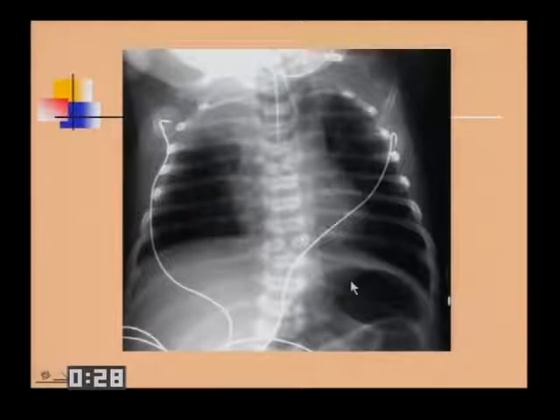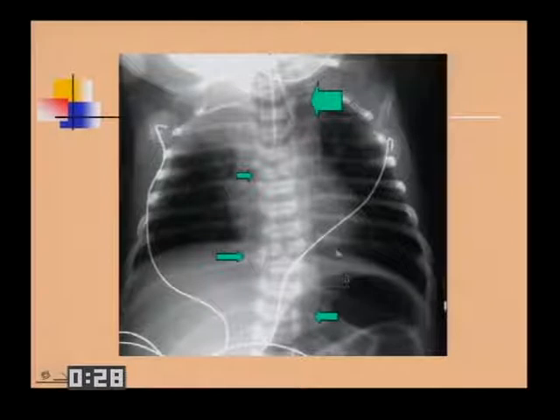But when you see all of these abnormalities in the vertebral bodies, cleft vertebral bodies, another cleft vertebral body, two examples of congenital bar deformities, which will increase scoliosis as the patient grows, you begin to think of VATER or VACTERL associations: vertebral, anorectal, cardiac, tracheoesophageal, renal and limb anomalies.